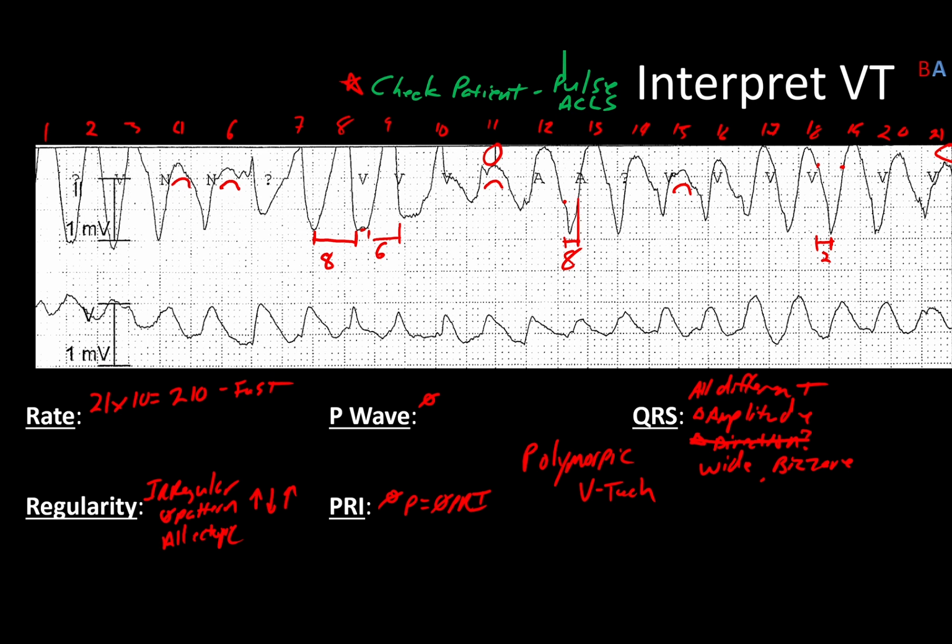and in fact the entirety of his heart was deprived of oxygen. This is one of the rhythms that his heart wound up producing over the course of all that. In fact, it was very close to the end, when the patient passed away, that the heart rate sped up like this and then rapidly declined shortly thereafter. So I want you guys to keep in mind that this is the rhythm you will see when someone's heart is trying to quit on you, and why rapid intervention is so important.